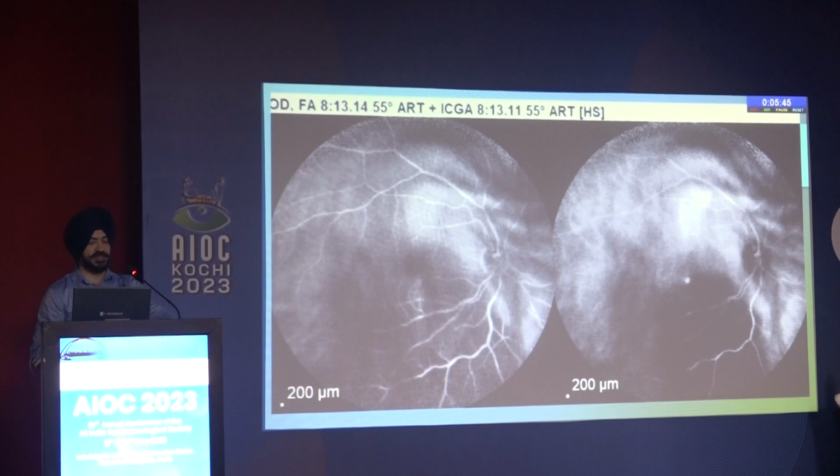This patient actually presented with a diagnosis of choroidal melanoma with a large elevation in the lower part of the retina with macula involved, and a simple test with ICG picked up a polyp. It was a case of PCV with intense subretinal bleed and hematoma, and we just did the focal laser for this leak and the patient recovered 6/6 vision.